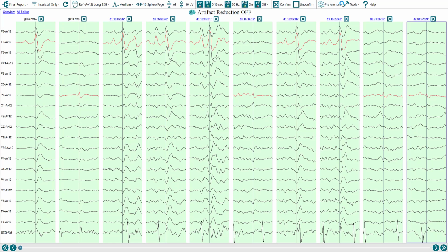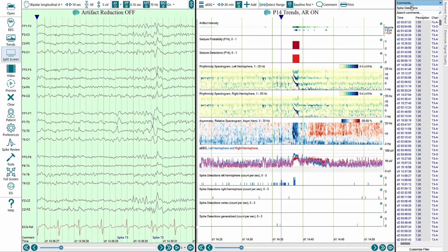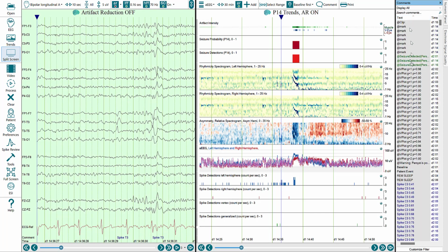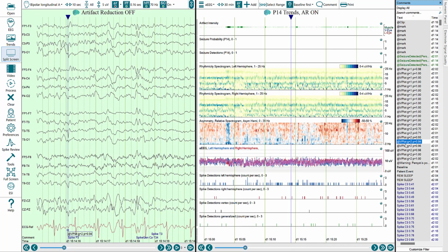And you can also export those groups that you've created by selecting the Tools menu and then select Export Groups to EEG page. So rather than the Options menu, let's go to Tools, Mark Groups as VPlot, and those two groups have now been marked. So when I close Spike Review and display all, and then sort them alphabetically, there's my group 1s, which are all my T3s, and then group 2s, which are my P3s. And that's the process of using the new Spike Review.